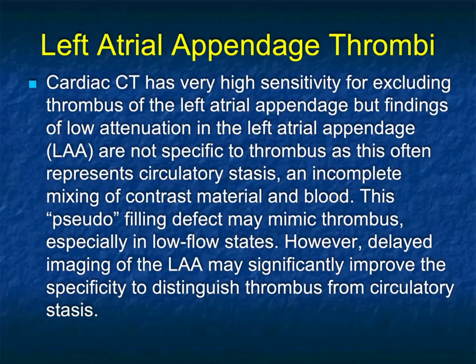Now, in terms of thrombi, some locations are more common than others. Remember, in the right heart, I mentioned patients with prior catheters, but the left atrial appendage is a very common place for thrombi.